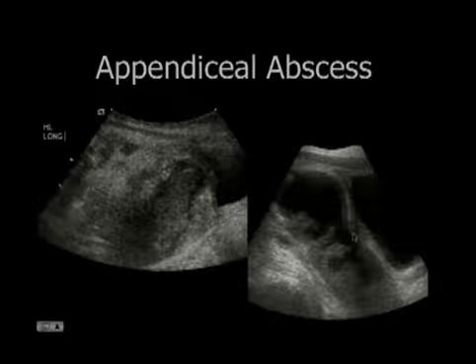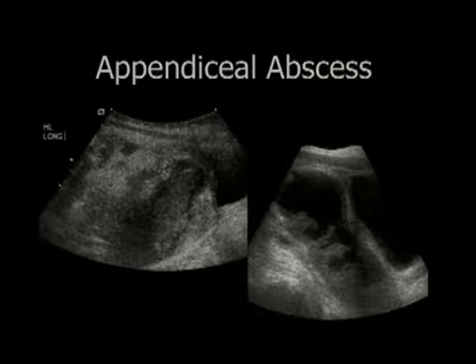And lastly, always look down at the cul-de-sac for abscess. Again, now that you've made the diagnosis, our job is to try to inform the surgeons and the clinicians what sort of treatment is possible. If you have a large abscess or at least have concerns about that, that child may benefit more from interventional drainage and an interval appendectomy after the abscess and infection has cooled down. If you don't see an abscess, then the surgeons may elect to do a primary operation.